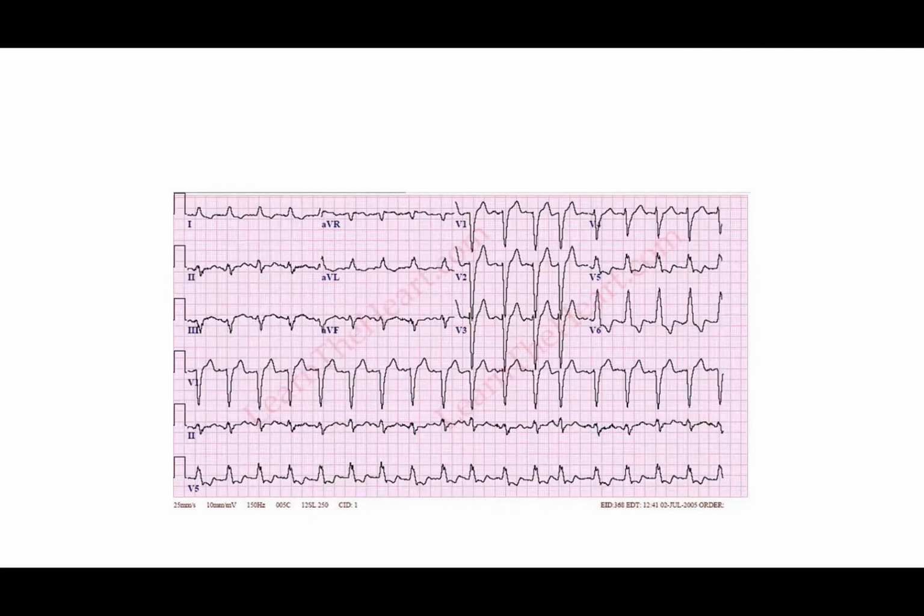All right, let's do the next one. Pretty much the same thing going on here. You just got to get used to looking at this stuff, right? That's all. So T wave, P wave, QRS, T, P, QRS, T, P, QRS, T. The P wave is kind of buried in there somewhere, a little artifact here. T wave, P wave, QRS, and so on and so forth, okay? Just helping label some things if you're having trouble seeing it.